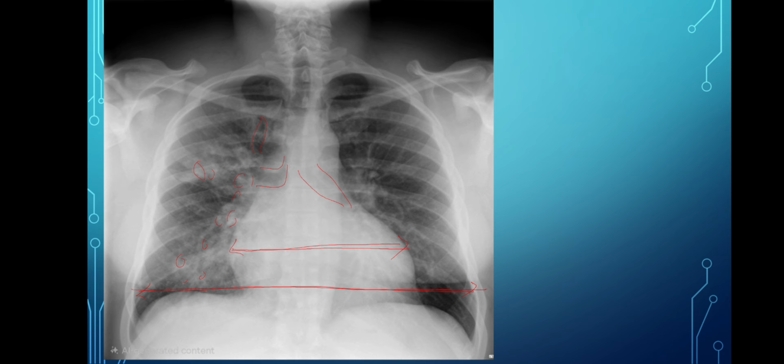So, right-sided bronchopneumonia. The left-sided lung field is normal, the hilum region is normal, and the bronchovascular markings do not extend to the lateral one-third of the lung zone. So this is right-sided bronchopneumonia.